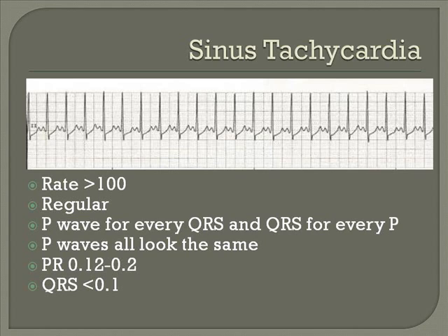If you cannot see a P wave in there, then it's defined as something else. And the way we're defining it's a P wave is that there is that wave before the QRS and it is consistent beat to beat. When you measure this one out, it is about 12 beats, so that's about 120 beats per minute. It's regular from R to R.